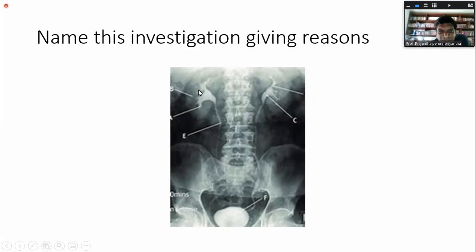You see that? Papillary impression. What you call papillary impression. So if it is clubbing, right? It's like that now, no? Clubbing. Correct? That is IVU.